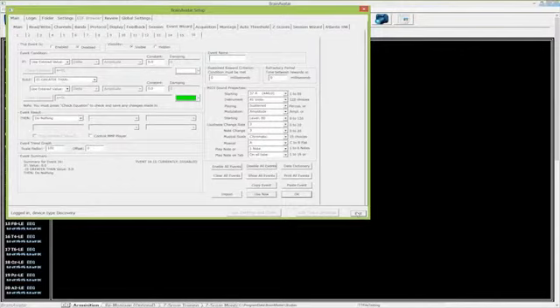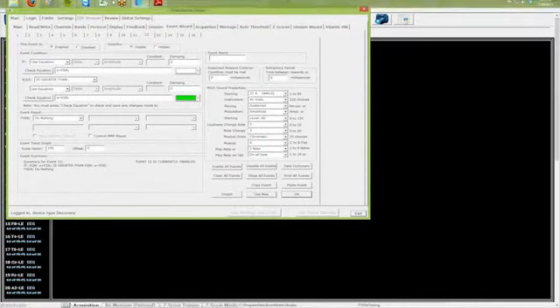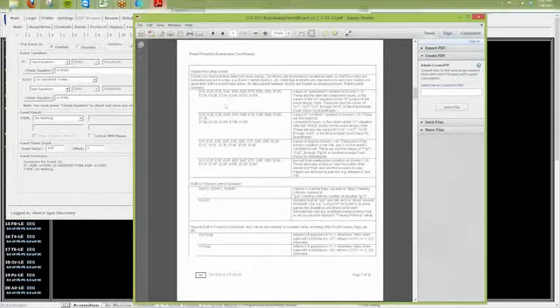But there's a reason I'm showing you guys, and there's always a method to everything that I show you. And that is because what if you don't want one control? What if you don't want one variable? What if you want multiple variables? That's why I'm explaining this to you, because now you have the capabilities and the abilities to control those multiple variables. For example, I have it set up basically when both are successful, and just so you can see, E5A is greater than E5B. Now, what is that exactly?